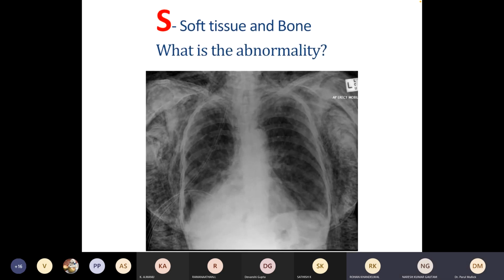Okay, so who said surgical emphysema? Ma'am Manu. Anu. हाँ, okay, good. Very good. Thank you. Excellent. This is surgical emphysema. No doubt about it. ठीक है?